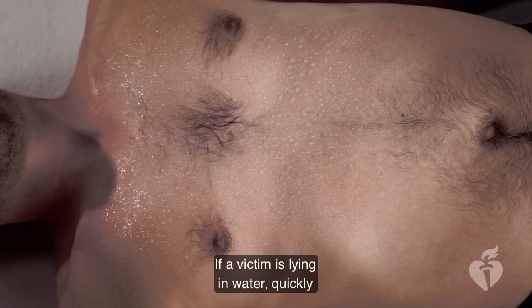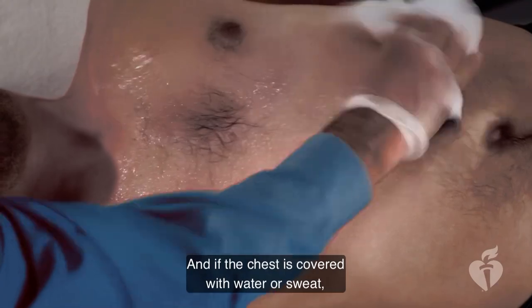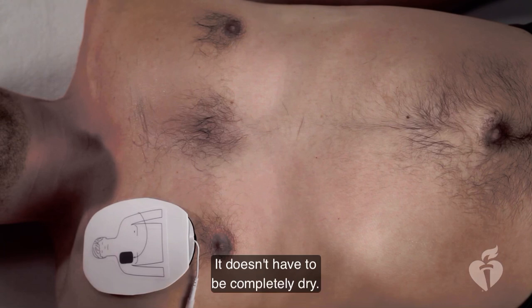If a victim is lying in water, quickly move them to a dry area before using an AED. But if the victim is lying on snow or in a small puddle, you can use the AED. And if the chest is covered with water or sweat, wipe it off before attaching the AED pads. But wipe the chest quickly. It doesn't have to be completely dry.